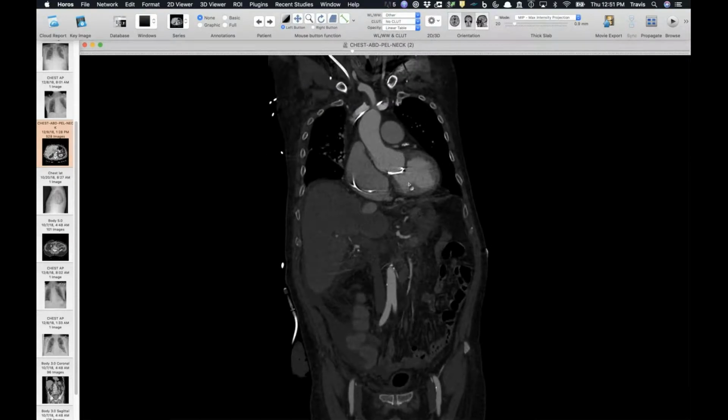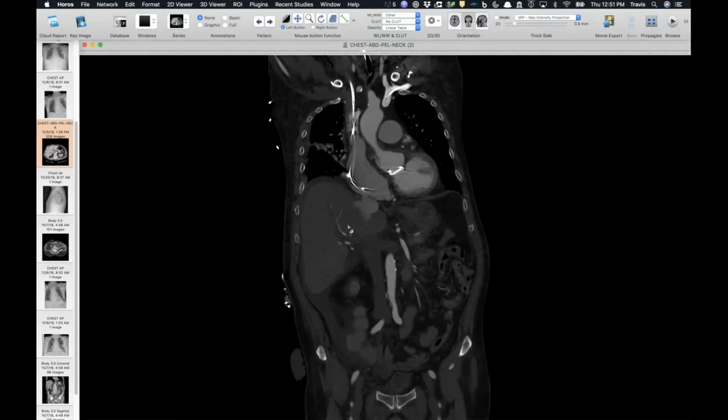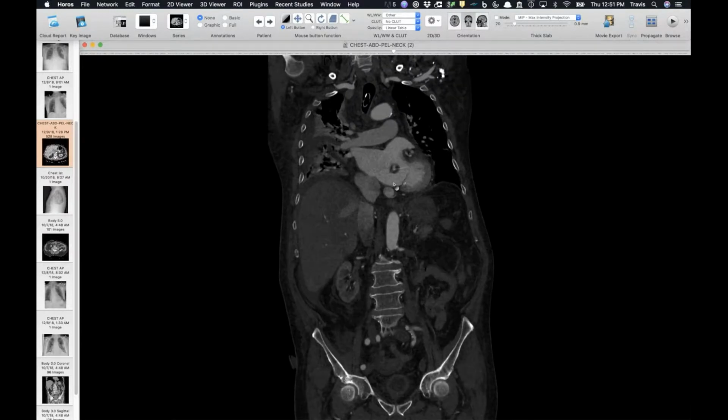And you can see it's much more vertical or horizontally oriented on this than it was before. Were we seeing the filling defect in this plane from the vegetation, or was it an artifact? So this is all vegetation here, yeah.